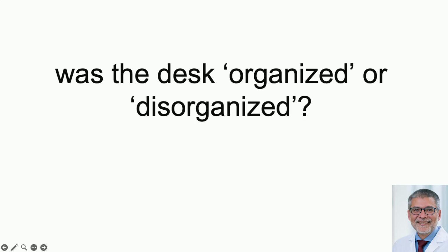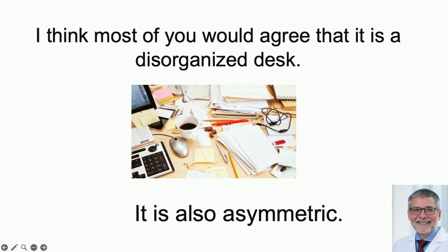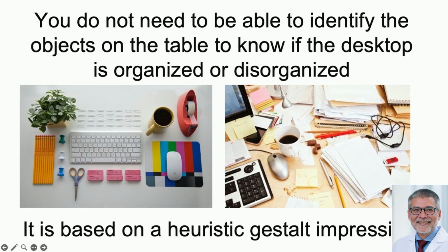Do you see a globule? Yes, no. Do you see a streak? Yes, no. Do you see this? Among experts, we are really bad at agreeing upon any given structure, but we are really good at agreeing when something is organized and disorganized. So the most subjective of features is the one we most agree on, and the most objective of features are the ones that we have poor agreement on. It just tells you the power of the brain, yeah? So that's a little bit about symmetry and asymmetry.